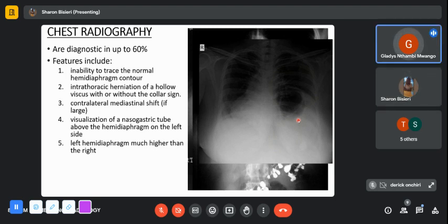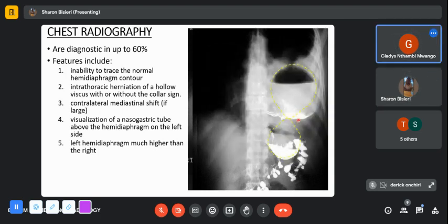What is that distal bowel that is being shown? This is the duodenum. Any other offers?